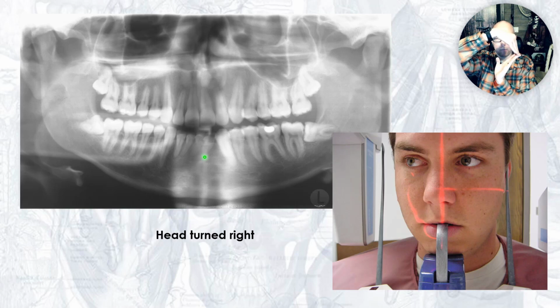In this case, the maxillary incisors look somewhat vertical because you see the entire root pretty much in focus in the focal trough. But the mandibular incisors are probably back quite a bit. So they probably look like this if you're looking at the patient from the side. What does that do to the roots of the mandibular incisors? They're lying now lingual to the focal trough, and they're going to be out of focus. They're going to be blurred, and in a lot of cases, somewhat in this case, not even recognizable. And so that's why you see that a lot. I talk about the anterior, especially the anterior mandible, as being kind of the least diagnostic part of panoramic radiographs. And so you deal with it as you can.